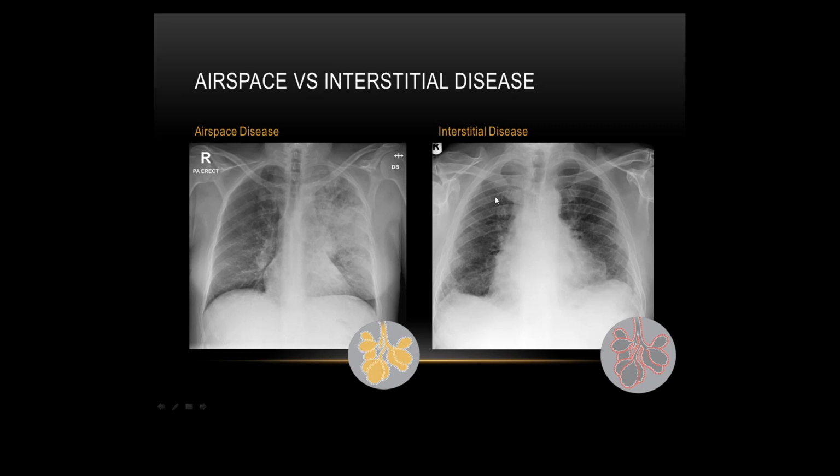If you get infection or some chronic disease within the interstitium, whether that be sarcoidosis, rheumatoid, or just standard ILDs, these lines become inflamed. You also get it in pulmonary edema, because you get fluid accumulation within the interstitium. So they become wide, and as you can see, as more and more of these build up, you get all these sorts of straight lines.